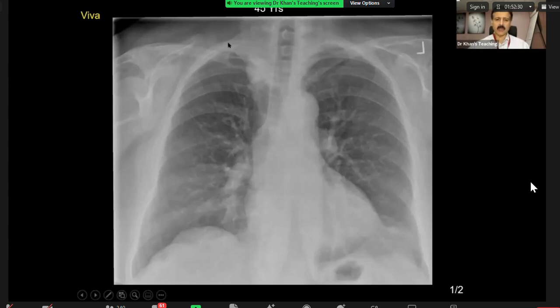So if a mass superior to the level of clavicle has a crisp and sharp outline laterally, it is crisp and sharp because there is an interface of air anterior to that. On the other hand, if the mass is sitting anteriorly, then the lateral margin will not be crisp and sharp. This is known as cervicothoracic sign, which is a classical exam sign.